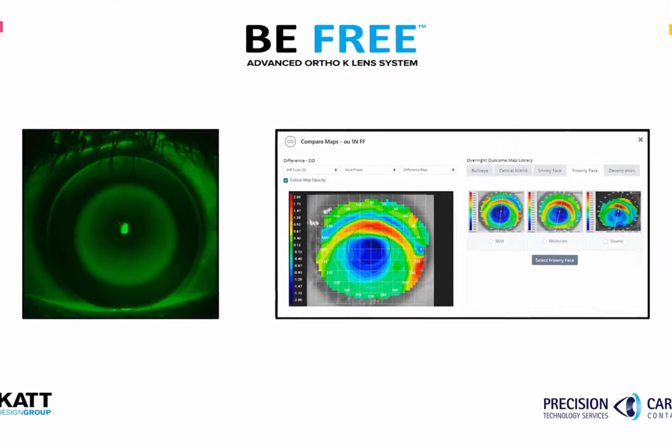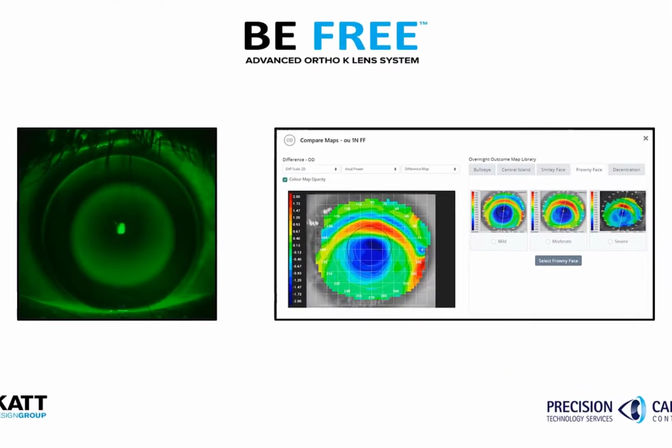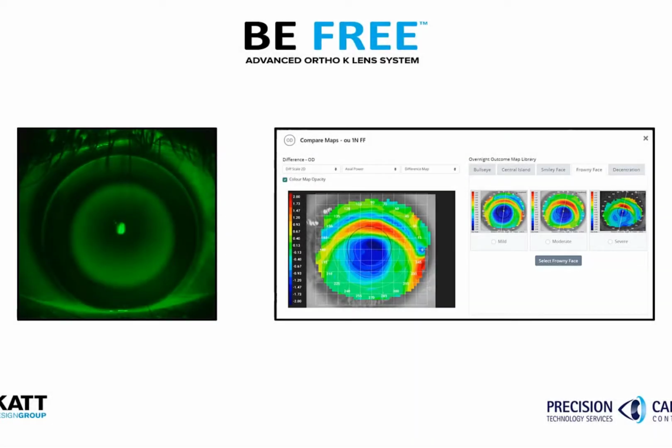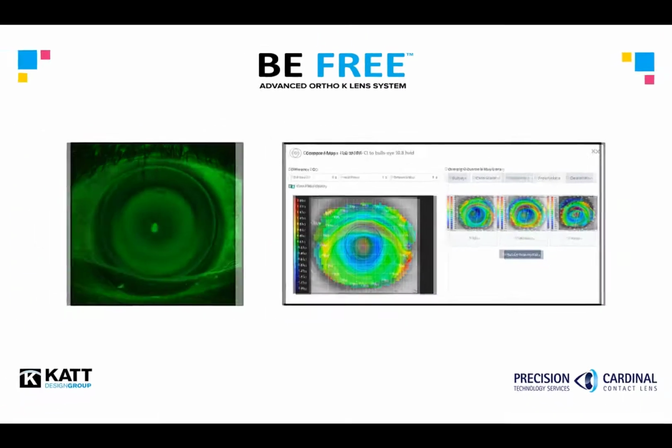Conversely, lens discomfort can be due to inadequate edge lift or a lens appearing low and tight in the periphery. This is resolved with the frowny face response. Again, choose mild, moderate, or severe based on the degree of change required. The frowny face response can also be used in cases of adherence or when a lens is hard to remove. Both may be caused by inadequate edge lift.